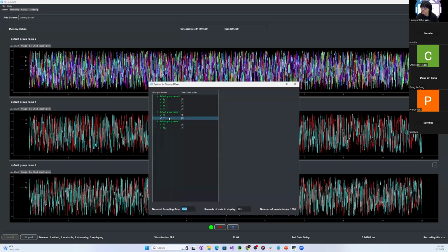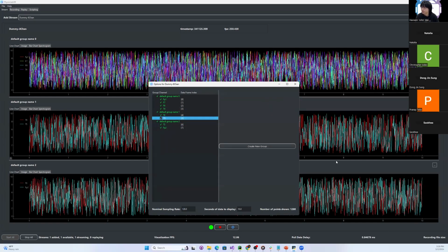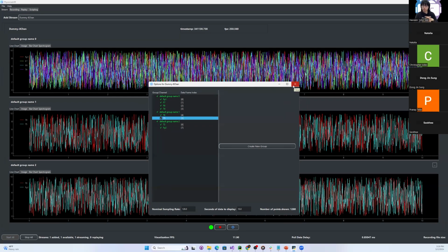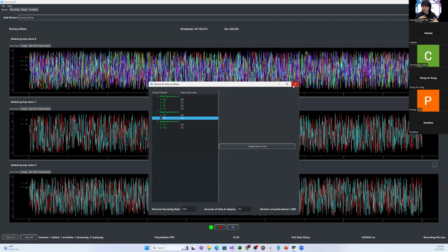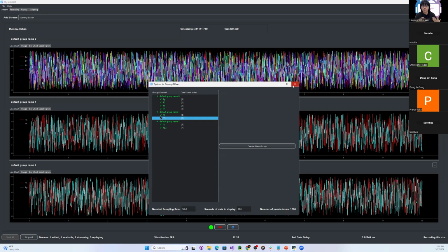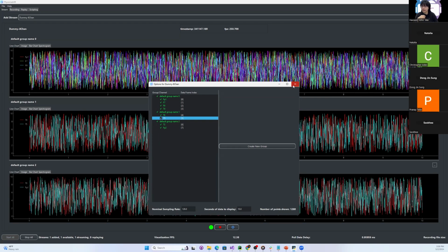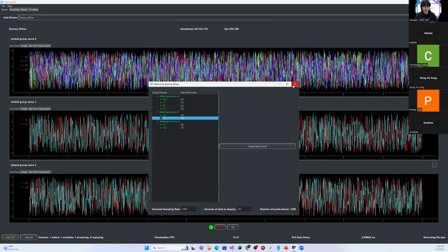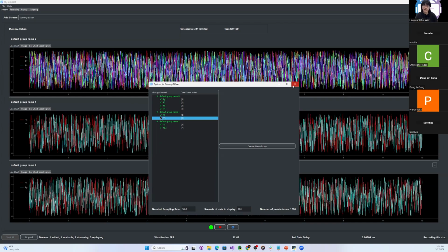Okay. And you can also drag channels from one group to another, so you can separate those visualizations. One of the reasons we are doing this is we want to put the related signal channels into the same group. So for example, signals from a device may contain accelerometers and EEG signals, maybe event markers, triggers, and maybe timestamps.